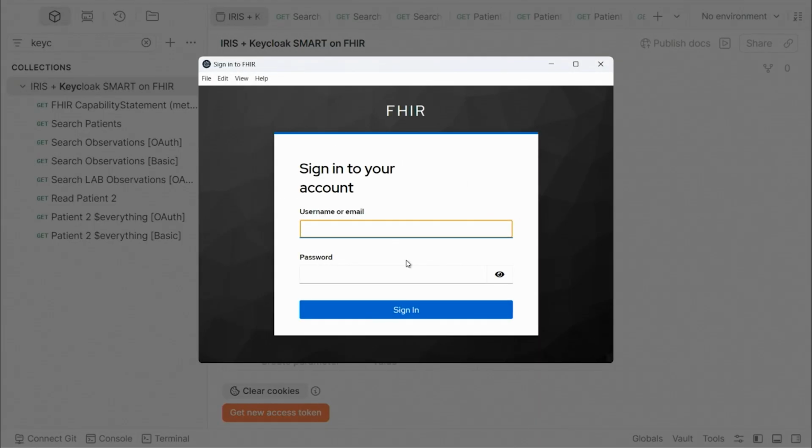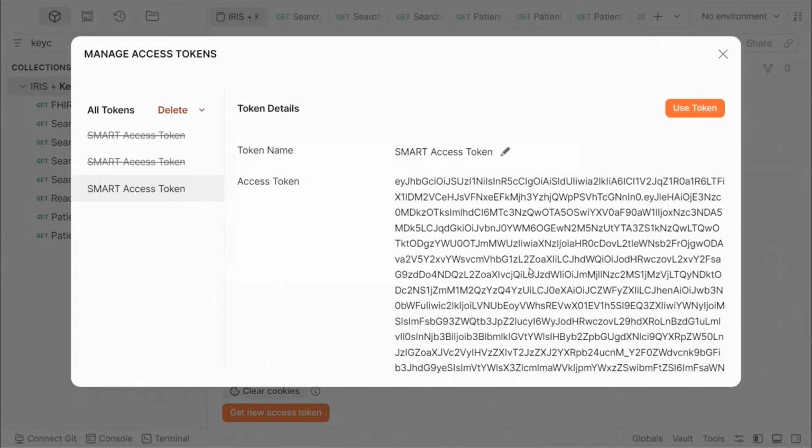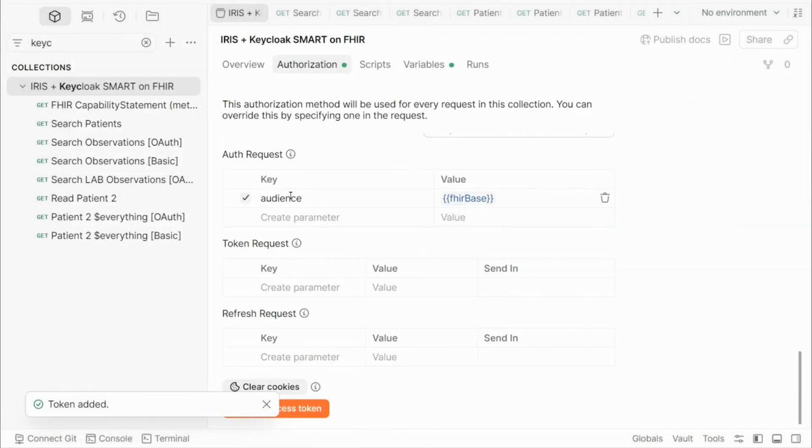What did I say my name was? Tani. Well, right now, I am not Tani. I am Alice. Alice from yes. Okay, so I got my token. I'll proceed. I'll use it.